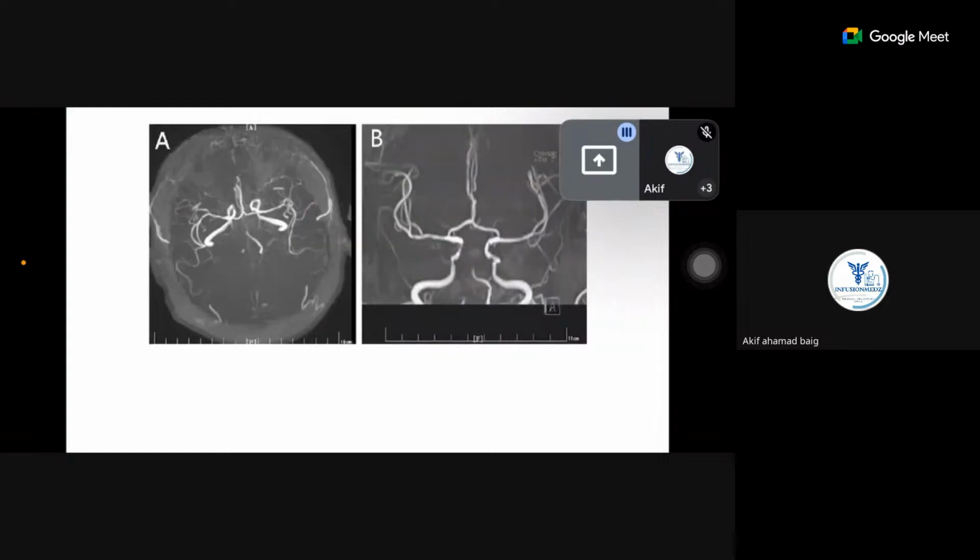Next is this. DNBs generally tend to be in good setups, where MR imaging is available. So what is this? This is the circulation of the brain. That's good. This is an angiogram. Very good.